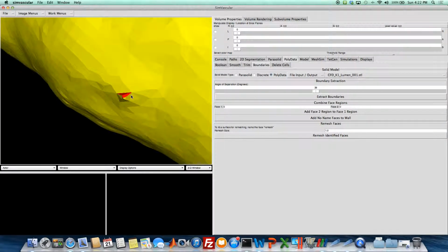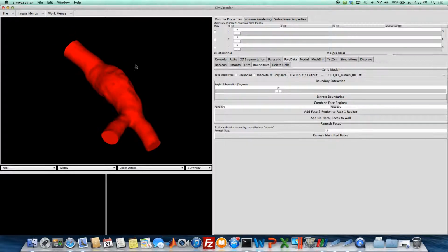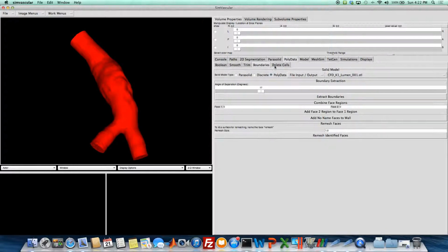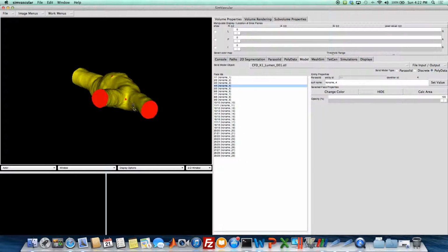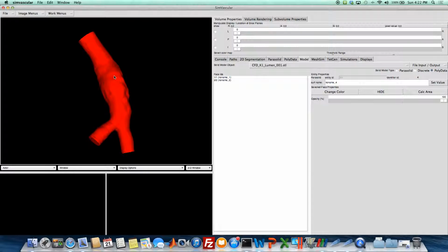However, we've included even more here in this weird part in the center. So if we continue to go farther down the scale, we'll see that we get more and more cells. I mean, we're defining a region to be less or more different. The angle between the cells is 17 degrees now, so we've got 29 different regions. You can see it's even picked out some area in here. And then if we set this angle really high, we'll probably only get like 3 or 4 surfaces. 2. We get 2 surfaces.